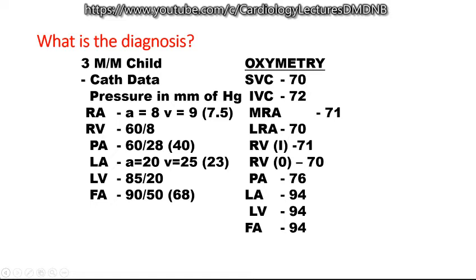So, what is peripheral augmentation? Yes, because of peripheral augmentation, the systolic pressure in the femoral artery can be higher than the left ventricular systolic pressure. Here the recording is from the femoral artery, but if it were from the aorta, then it could be an artifact. Here you have a good explanation: peripheral augmentation of the systemic pressure results in a higher pressure in the peripheral arteries compared to the central aortic pressure. So the pressure of 90 can be easily explained as peripheral augmentation.